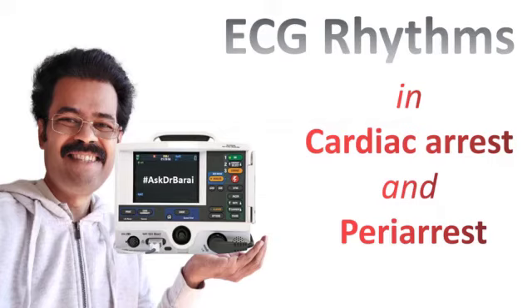So without further delay, let me show you the various ECG rhythms that you can expect to see in cardiac arrest or periarrest scenarios. In these scenarios, we can have a lot of different rhythms. Some of them are in the ALS algorithm, and some can be a bit unusual.